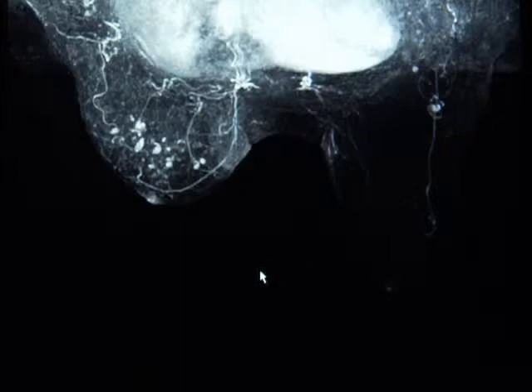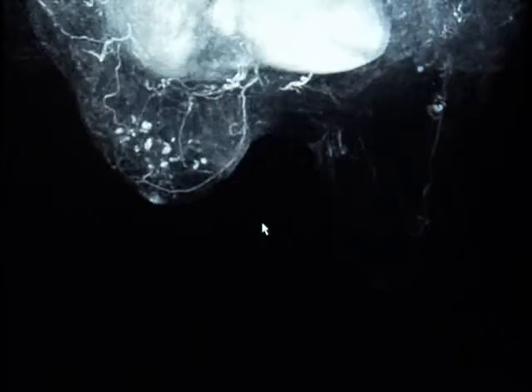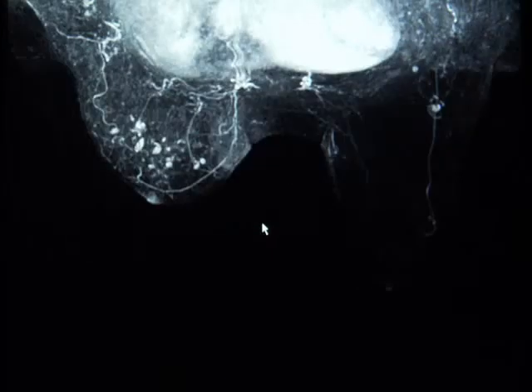This is a hanging protocol we use for our axial parallel imaging pulse sequences. Again, following our approach to each case, the first thing we evaluate is a 1-minute subtraction MIP image. In this case, you can see there's significant asymmetry in size of the breast, and there's obvious abnormal enhancement within the right breast. This patient has known right breast cancer, had a very large tumor volume by a remote exam, and is now partway into her chemotherapy, and they're evaluating for response.